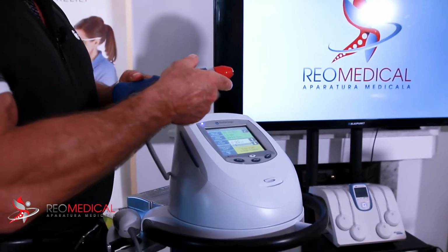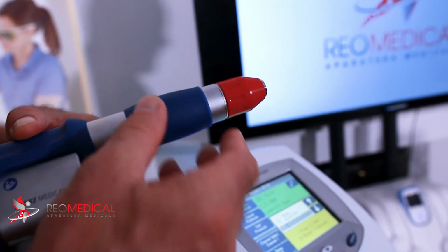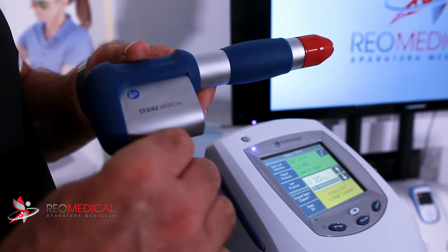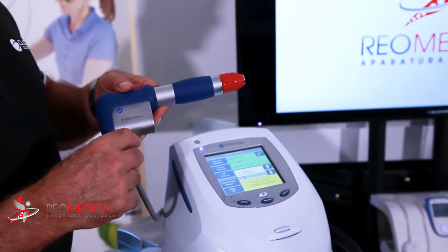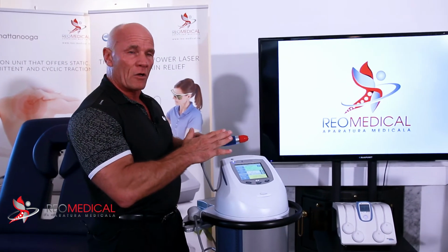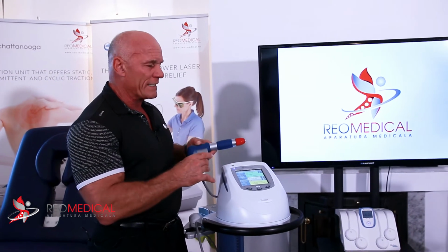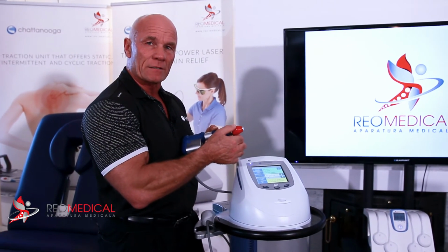The compressed air then comes into this barrel, and we refer to this as bar pressure. Now the bar pressure and frequency are often quoted to us by salespeople. But to be perfectly honest, there's nothing in the literature to say that frequency makes any difference whatsoever. And the bar pressure across manufacturers is all practically the same. So what makes the difference? The difference is the transmitters.